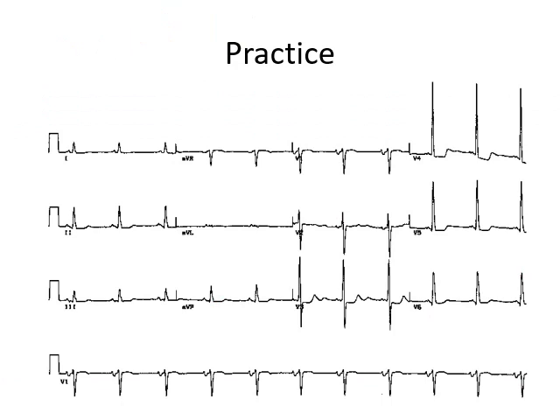1 second. Alright, in this ECG, I want you guys to focus on lead 1 and 2 again. You can see lead 1 has an upright P wave and lead 2 has an upright P wave, and each P wave is followed by a QRS complex, which tells us that the ECG is in sinus rhythm. Then I want you guys to focus on lead V1, this lead down here.